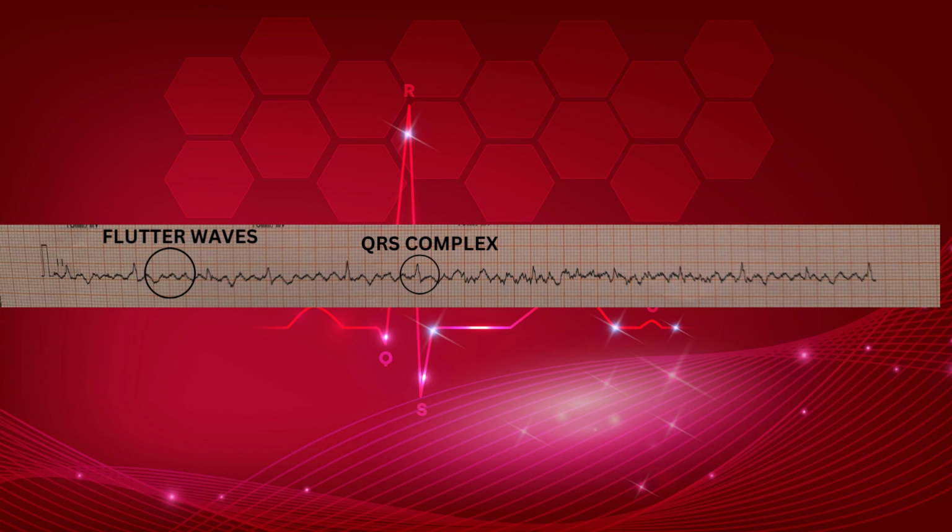Atrial flutter is commonly associated with atrial fibrillation, and sometimes the ECG may fluctuate between these two rhythms in the same patient. Unstable patients with this condition should be treated with emergency cardioversion, whereas rate control and treatment of the underlying condition is the first line of treatment in stable patients.